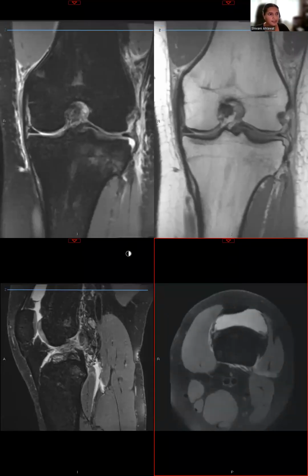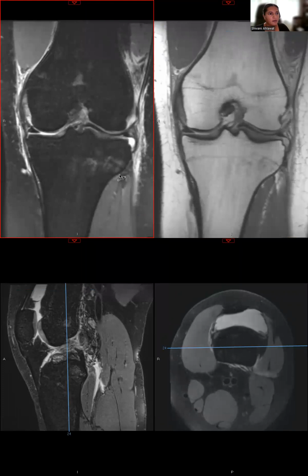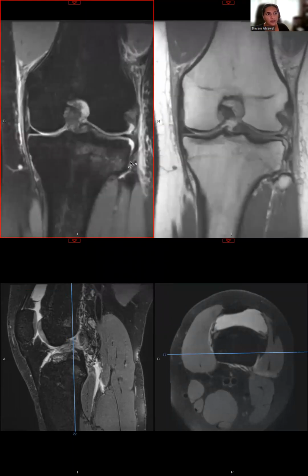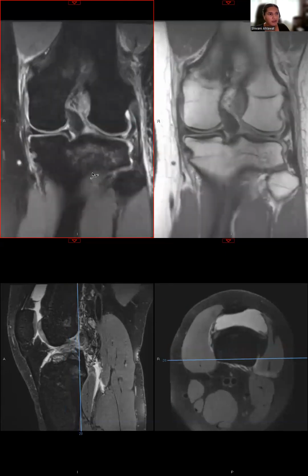So this is one of the last examples that I'll be showing you. And this patient, as you can see already through this midline image, has an ACL tear. So let's start first with the lateral meniscus. We already see abnormal signal extending to the inferior articular surface, so this meets criteria for tear. There's abnormal morphology of the body and posterior horn; it doesn't look like a triangle. And there seems to be a little too much meniscus protruding towards the midline. So maybe a big flat fragment.